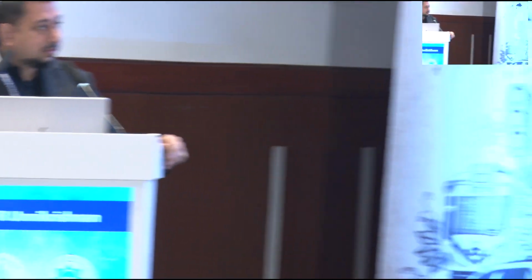Thank you, Unni. Can you tell me, in the clinic, we will have one or two questions only. In the clinic, we start with early fluid appearance on OCT. Now with OCTA, can you identify a few lesions in CNVM where you will say I will start treatment, even if there is no fluid on OCT? On OCTA findings, will you start injections? At present, I wouldn't, sir.